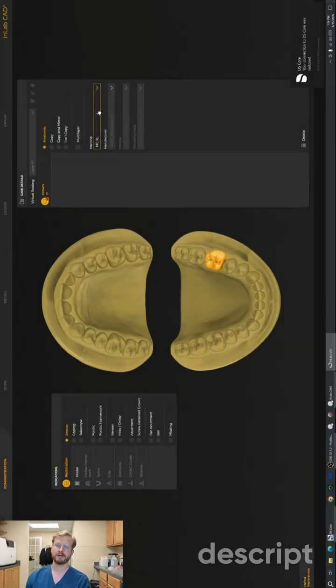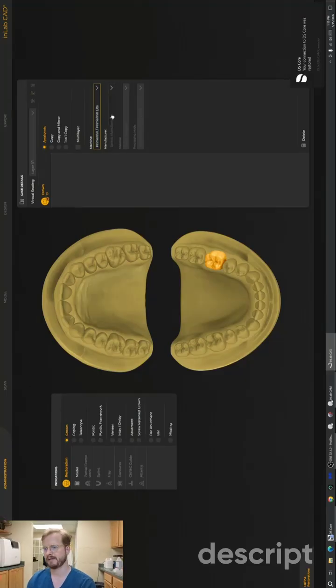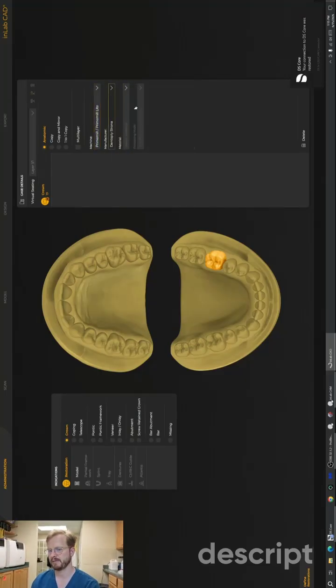We have an implant crown to restore today. Let's show you the workflow so that you can see what a custom abutment looks like and a custom implant crown. So we'll begin the way we always do in administration by designating the material that we will be milling with.